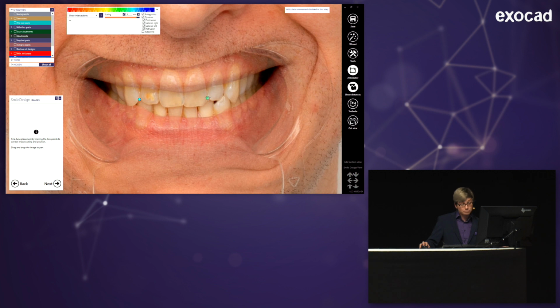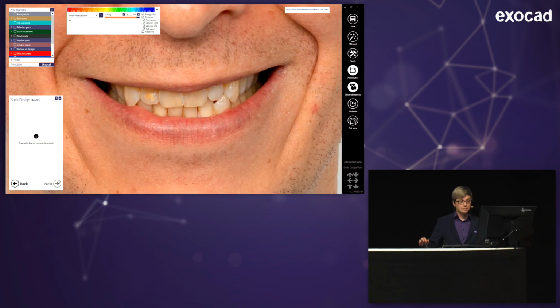So you see all those steps again. Maybe now you understand what I'm doing a little bit better.